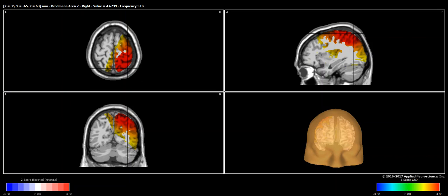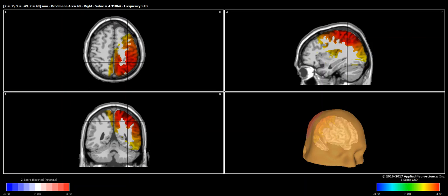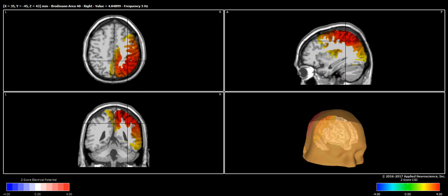This is a video to demonstrate the new labeling procedures inside of NeuroNavigator. This is our standard 4 view where one can navigate through the brain. You've seen this before. One can use the cutting tool to cut through the brain, etc., and have different renderings. But what we're adding now is connectivity with labels.